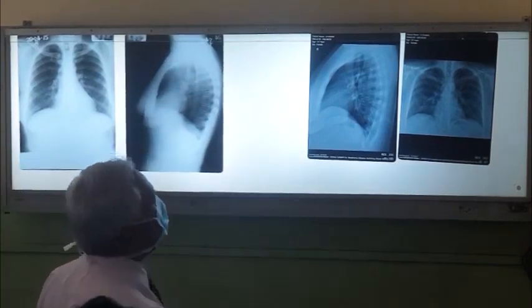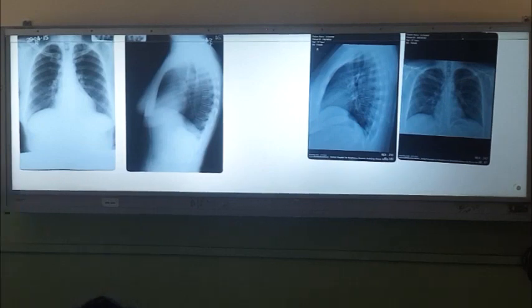These are normal looking X-rays. Although we call them X-rays, these are radiographs. X-ray means X-ray beam, and so we normally call it chest X-ray. All doctors should be able to read chest X-rays, because in the OPD, when you post-intern, you are supposed to sign for medicals. At least you should be able to say whether it is normal or abnormal. So any doctor should be able to read chest X-rays.